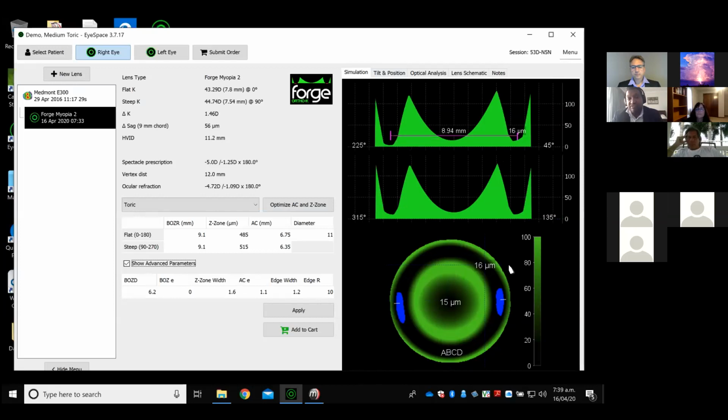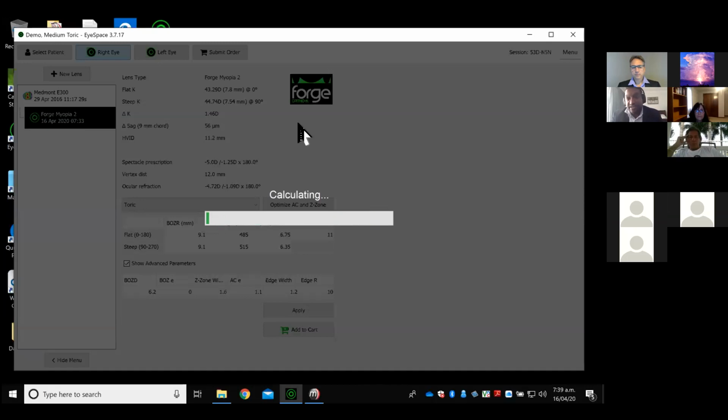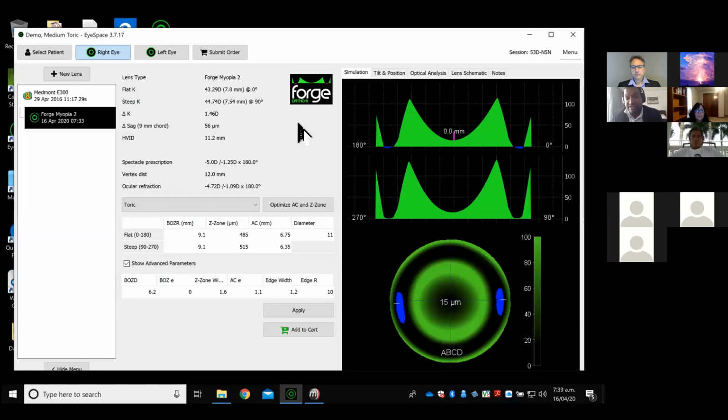It's going straight through the lens simulation. Then it will take 90 degrees away, and it tells you those degrees here. So that's just for everyone's reference as to why that's done in the way it has. Anytime I go into here and reload the map, it'll automatically start the map design at the principal meridian, so flat and steep meridian.